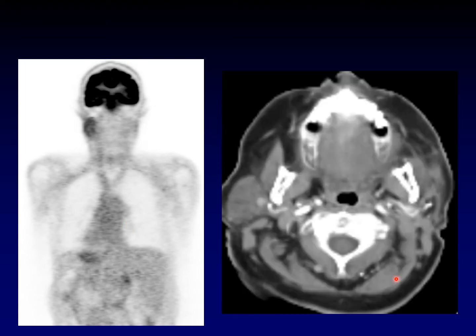Here's a patient where there's clear asymmetric uptake in the lateral neck. This could be very confusing, except it's on the wrong side. Has this patient developed new lymphatic spread, contralateral metastases? No, this patient has atrophy of the parotid gland, and that's a normal parotid gland on the other side. Right? Patients who have surgery, patients who have been irradiated will frequently have diminished uptake within the irradiated salivary glands, and that asymmetry might be confusing. So this is glandular uptake.